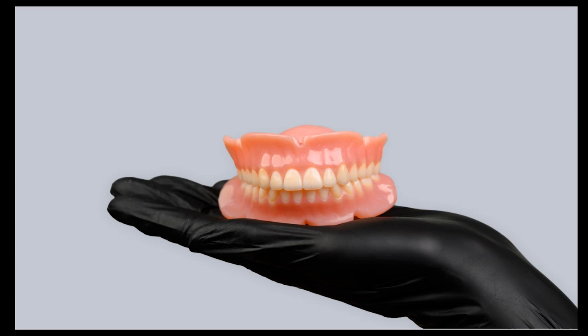At first, you're going to see all the models are gray because they're not yet analyzed. Once you run the analysis on the tray, you're going to get feedback of which models are green, acceptable and compatible for TrueVoxel, and which ones are red. Red models, if they are compatible with TrueDent in general, can still be applied basic shades. Any model that you have with bridged teeth can still be used with the basic shades.